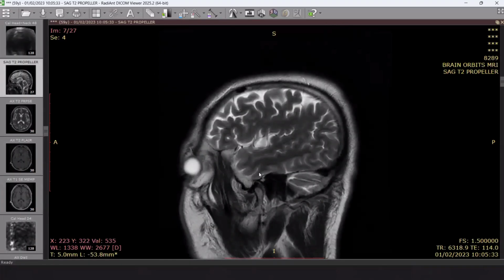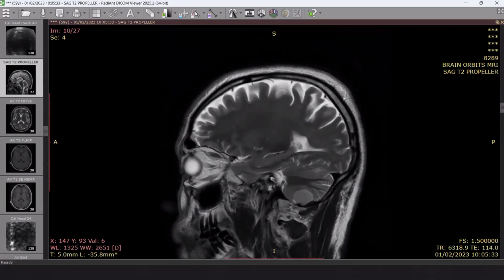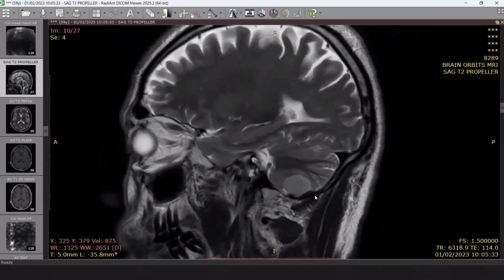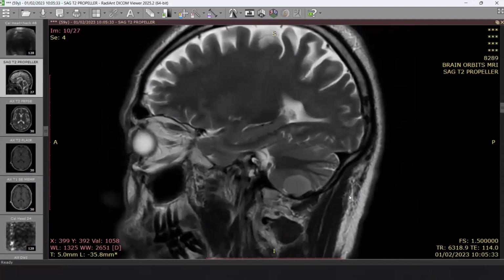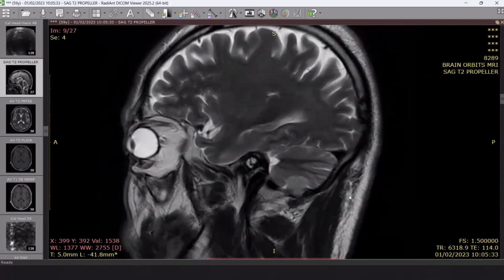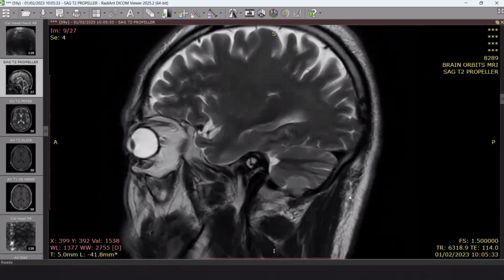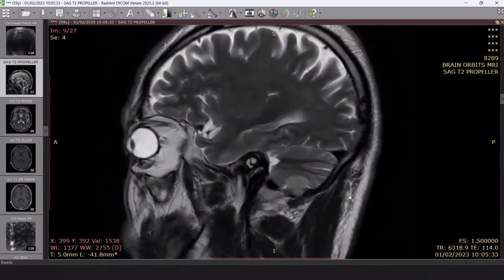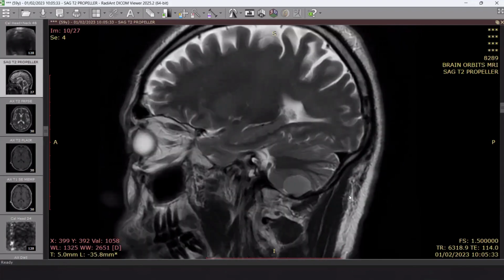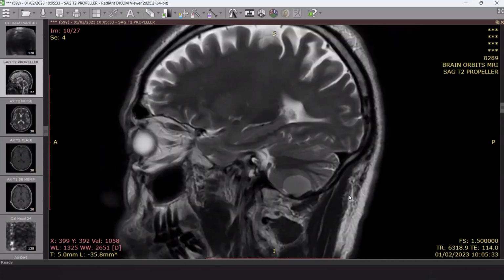Yeah, we don't have any history of fits. Okay, sir. On sagittal T2 images, the same lesion is redemonstrated, and is again iso to hyperintense relative to gray matter. It seems like some cystic sort of lesion, but it is not following the perfect signal of fluid.